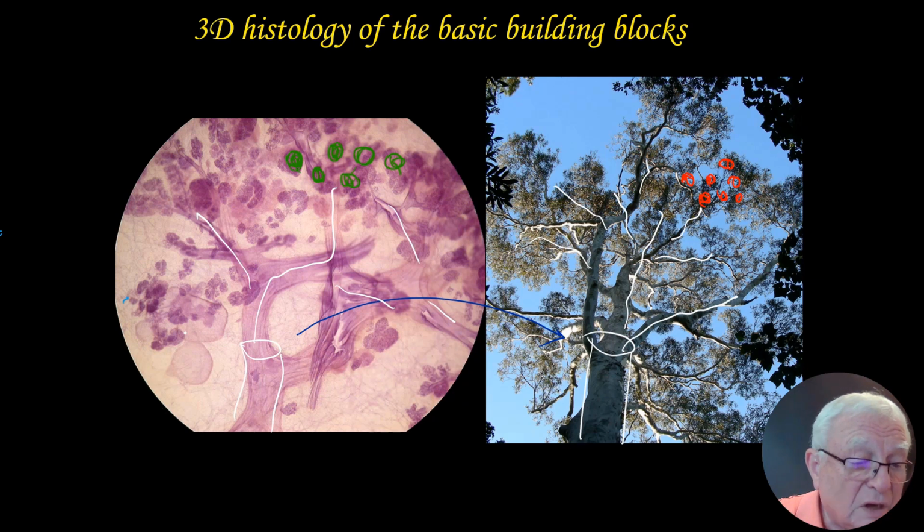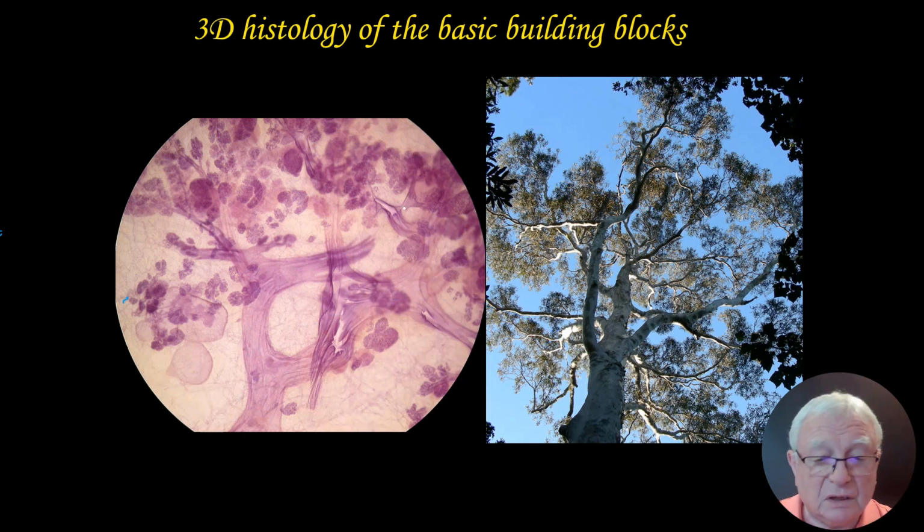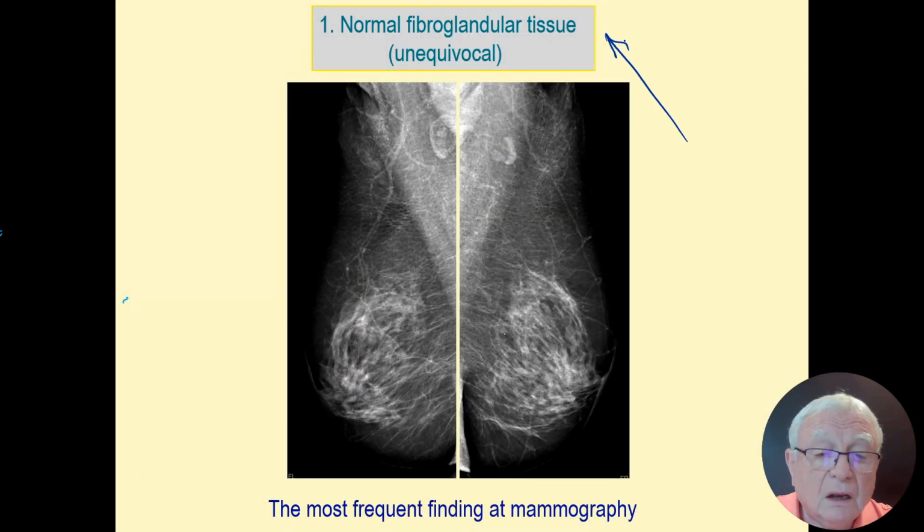And when she's aging, these are going to disappear. When winter time comes, these are going to disappear. And the ducts become skinny. Ducts don't change. Wintertime, springtime, they change, the TDLUs. I tell you, Mrs. X, you don't have any mammographic abnormality.